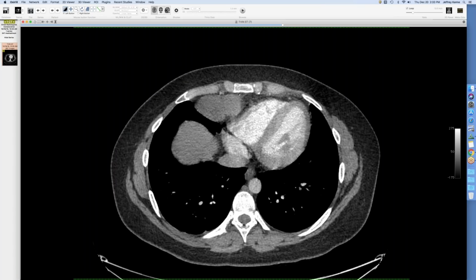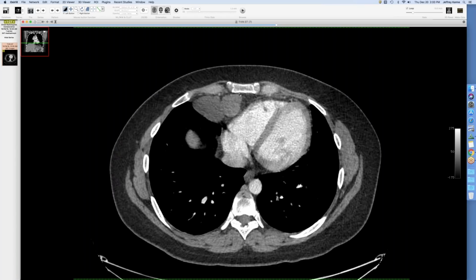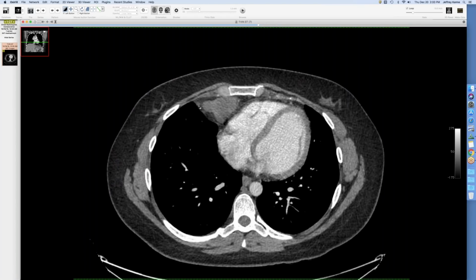Did it have a lot of malignant features? Do you perhaps know? I did not. It just talked about like the stromal stuff and a bunch of genes I'd never heard of. So Jeff, was this then mediastinal? I mean, it's got a very sharp. You can see it's in the mediastinal fat here.